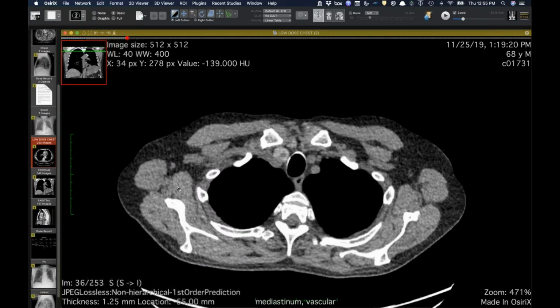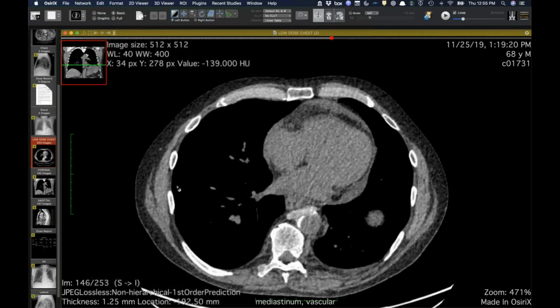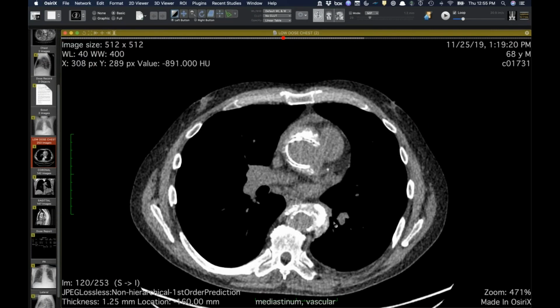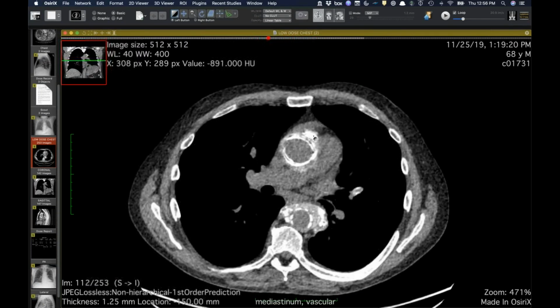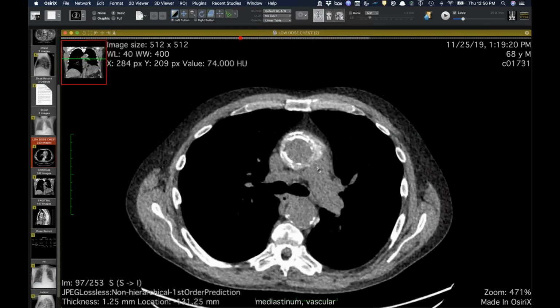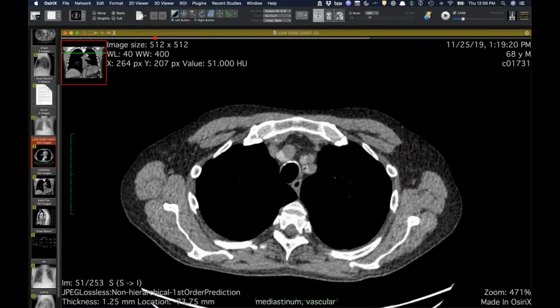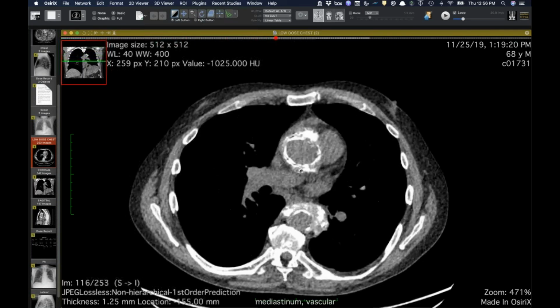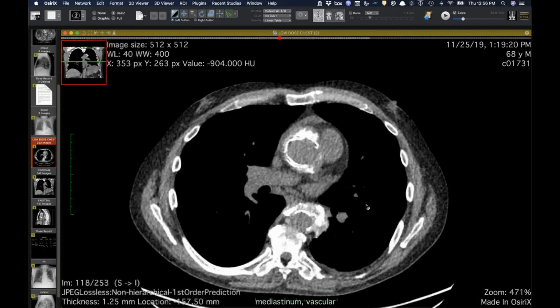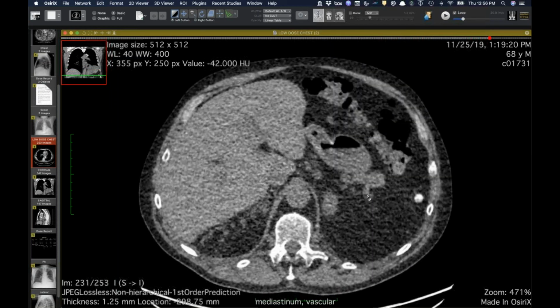And then this is really interesting because he had a lung cancer screening CT. So this is a non-con, and you can see that there's all of this, some of it dense calcification or ossification perhaps, and some of it more amorphous. And it really encompasses the entire aorta from just above the sinuses through the arch. Not only that, you see some of this stuff extending along the arch vessels as well. Got this weird finding involving one of the pulmonary arteries where it looks like the same thing. And then there's a chronic pericardial effusion.